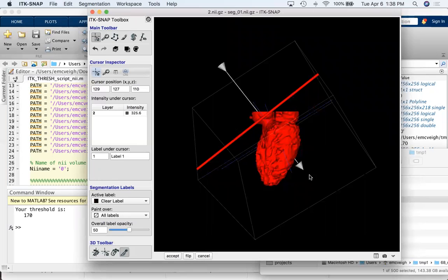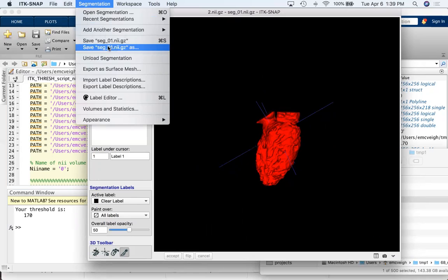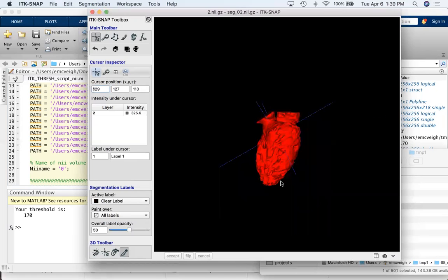Then I'll click, click, up. My arrow's going the wrong way, so you can hit flip. Goes this way. Now accept, and I cut that. So now we have that. The part of the arrow is what is removed, right? Yeah, it's the one that's going to change. So then I'll save this as 2, because that was the second time frame. Yes. So you can see we get into a rhythm here.